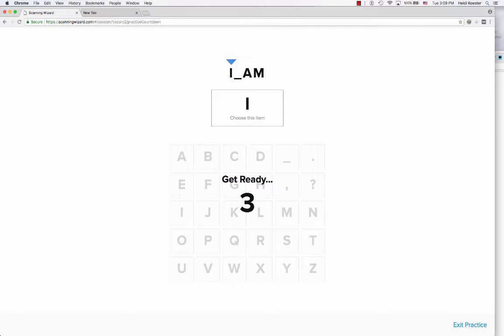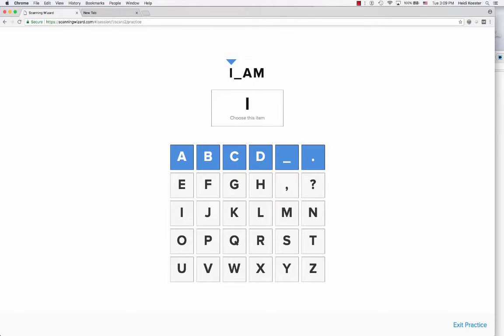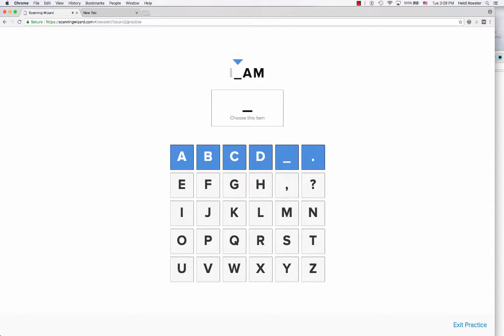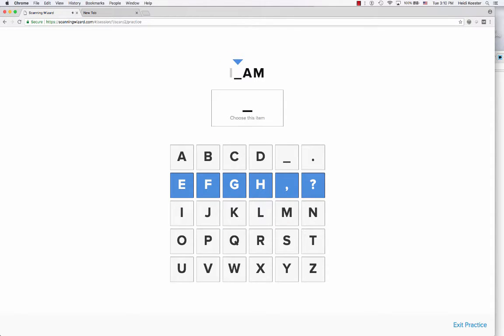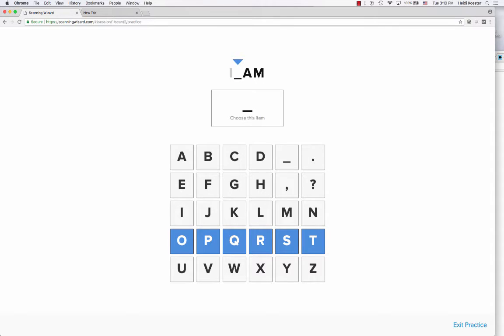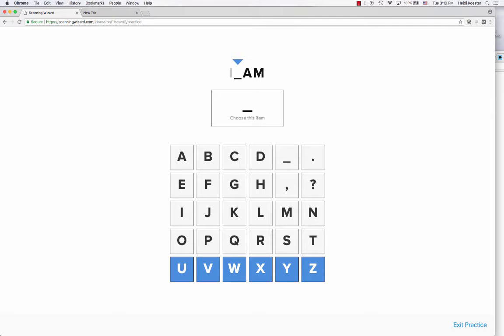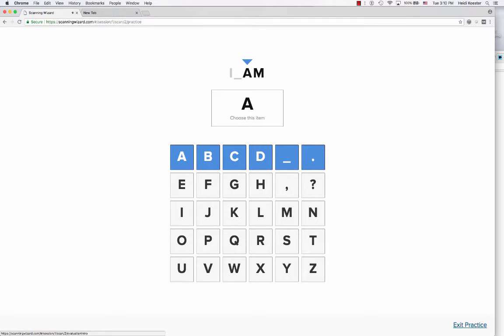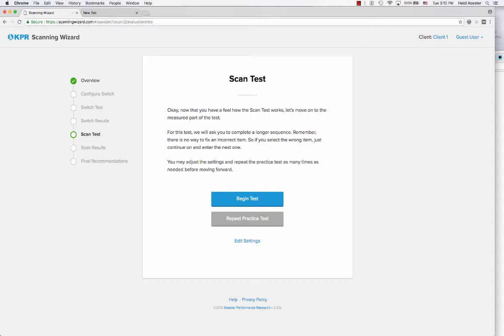I hit the switch to start the test. Wait. Wait. So don't hit the switch. Hit. Hit. Hit. Wait. Wait. Wait. Wait. Hit. Hit. Okay. Wait. Wait. Wait. Hit. Hit. Wait. Okay, so that's the idea there.